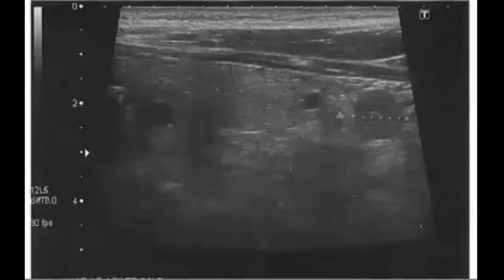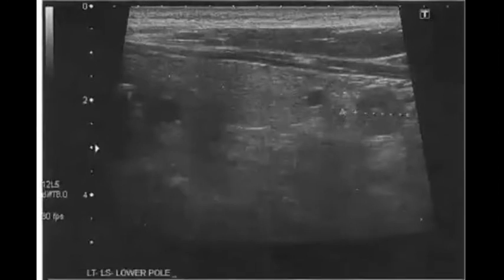Okay, let's go to this case, which starts with ultrasound. And you can see the ultrasound in this patient. And this is the thyroid or the neck. So how do we describe it? Yes. So there is a thyroid ultrasound. So what do you see? Our ultrasonography experts, Hayam, nice. There is a nodule, a solid nodule, perfect.